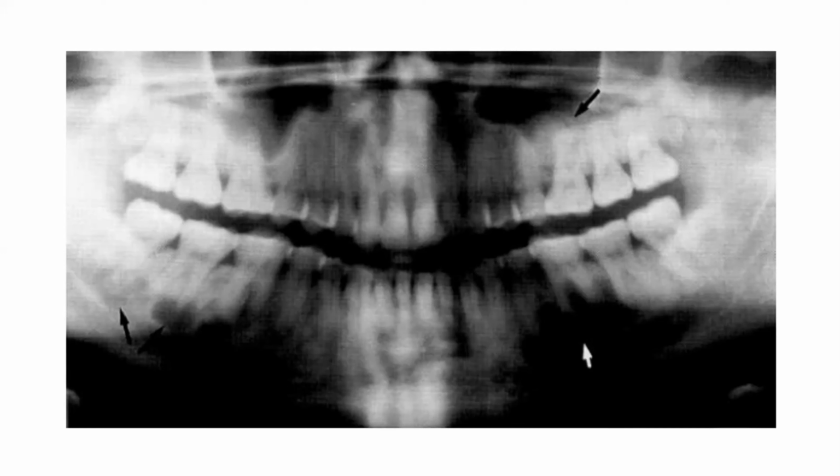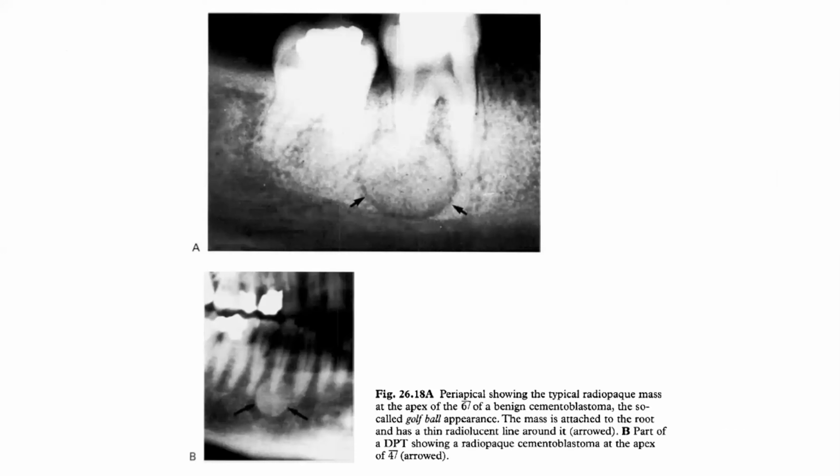We also have a familial gigantiform cementoma. It is a very rare familial fibrous cementoma. It is inherited as an autosomal dominant condition and confined almost exclusively to young, so 10 to 20-year-old, white people. The lesions characteristically show relatively rapid growth, causing marked facial deformity. Next, we have a benign cementoblastoma, also called true cementoma.